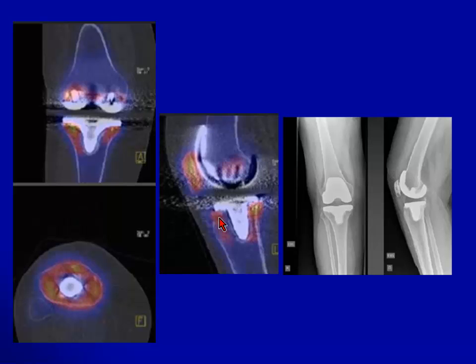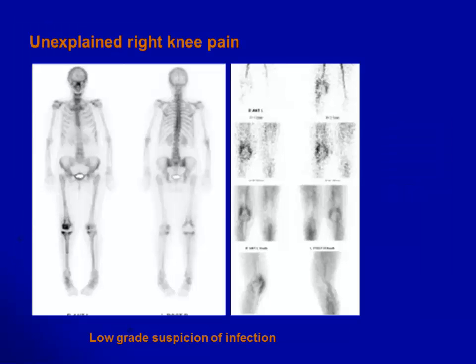There is some fluid in the suprapatellar region. There is lucency, there is edema there. It's a hypersensitivity reaction because you've got patella, you've got femoral, and all these joints are increased with some edema reaction, so it's inflammation all around, which is causing increased uptake.